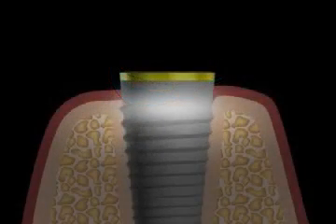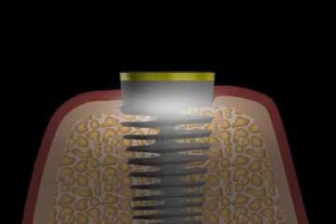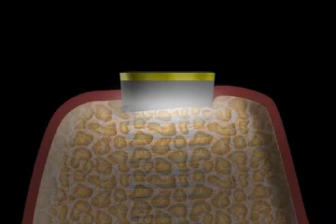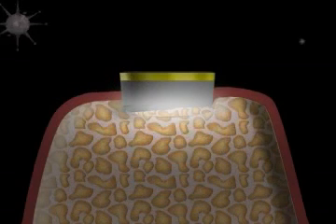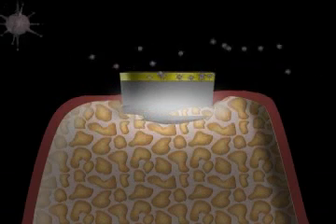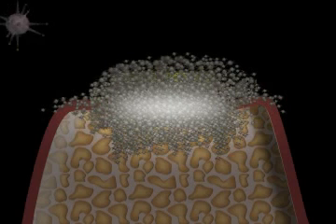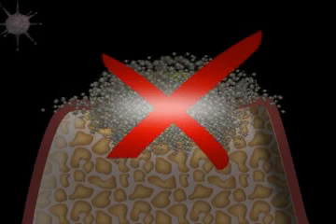The implant surface is rough, and this assists with optimal bone healing. It enables the bone to literally intertwine with the implant. However, this rough surface also provides an ideal bacterial hideout and nesting area. As soon as the implant is no longer within the bone, it is lost due to bacterial settlements and associated infections. Companies reacted to this problem by polishing the upper parts of implants. This was supposed to stop bacterial settlement in case of bone reduction, and worked with partial success.